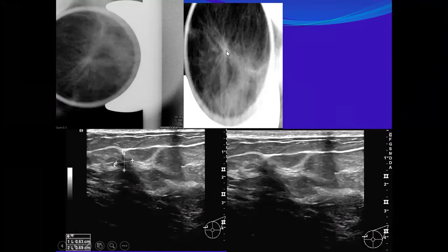With difficulty, I could convince her to do the spot magnifications to clarify that area. When I saw the central high density region, I suspected that this is a malignancy. I took her to target the same area, and it was difficult; it was non-palpable. She just came for screening, with no palpable area. I was searching, and she doesn't like the study.